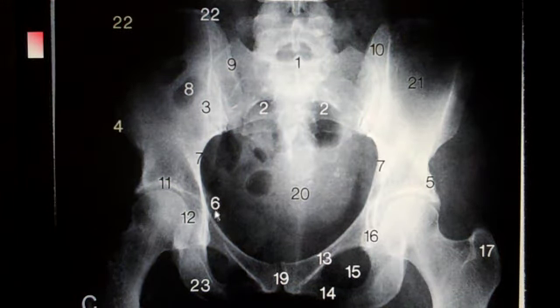Number 9, sacral ala. 10 is labeling the posterior aspect of the ilium, but again, posterior aspect comes all the way down to right here, and chiropractically that would be called the PSIS, and down here would be the PIIS. Out here would be the ASIS, and number 5 is labeling the AIIS. Number 1 is the first sacral tubercle. This is the spinous process of the last lumbar.